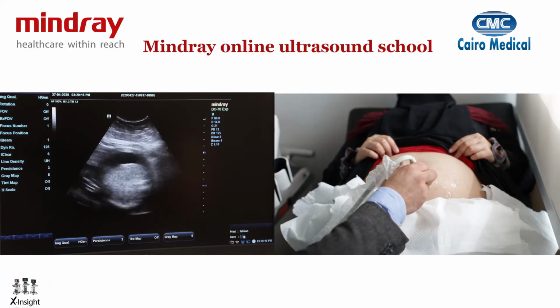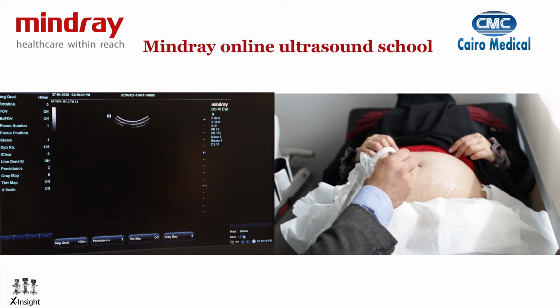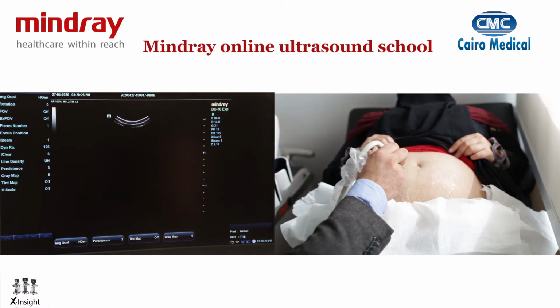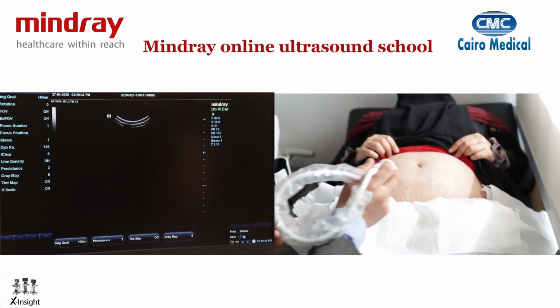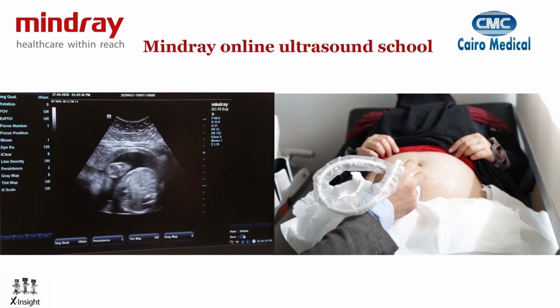This is not actually a very good way to get the standard views. So what I'm going to show you in the live hands-on session is how to first get the standard views and how we're going to utilize this into getting the views we're going to be using in 3D, and how we're going to be working with the 3D with the multi-planar modes and with the surface rendering to show you how we can actually get the best information while we're doing the fetal anatomy survey.